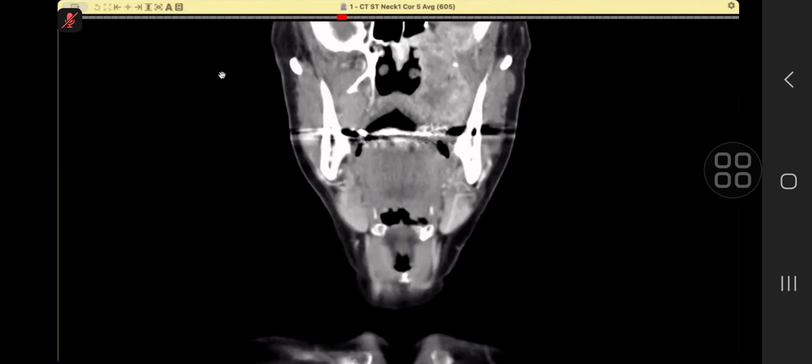Sir, this is an aggressive lesion, which is having an epicenter in the left maxillary sinus and in the nasal cavity, extending posteriorly to involve the left parapharyngeal region, infratemporal fossa, and causing marked erosion and destruction of the adjacent bones. So this can be a case of, keeping in view the advanced age, the differential for this include squamous cell carcinoma of the maxillary sinus, and this.